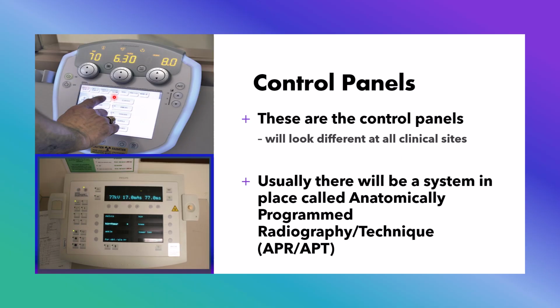On the control panel, this is a picture of our control panel here at the school, and so this is what it looks like. These control panels will look different at different clinical sites, but they're all going to have the same basic things where you can program the KVP, the MA, and the time.